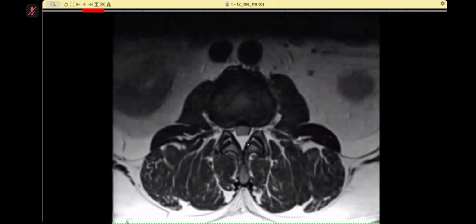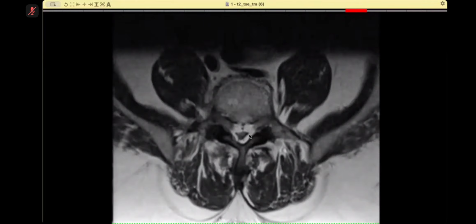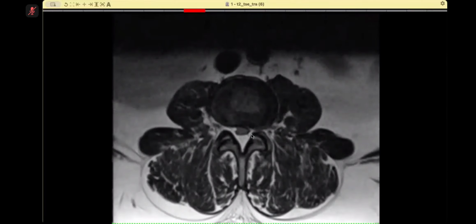As you come up, it becomes very tight. So what is happening is that there is epidural fat surrounding it. And in literature, they say that you will get a Y-shape thecal sac. I think this is a Y shape where I'm pointing out. But in our case, the shape becomes even more interesting. So this was a symptomatic case of epidural lipomatosis.